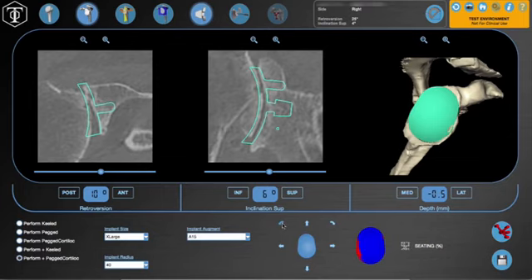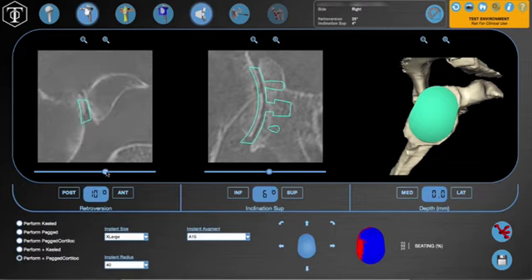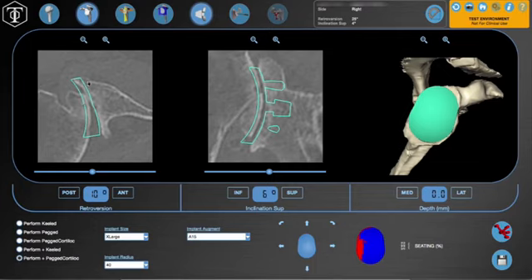So as we rotate the implant posteriorly, which you have the opportunity of doing on this program, you'll get more coverage from that posterior augment, preferentially posteriorly and inferiorly. And as I do that, you'll notice that the seating increases fairly substantially to 94%. I'm still a bit medialized, so if I want to play with the lateralization, I'm now at a 15-degree augmentation. I still have 81% seating. But if I look carefully, I do think that I'm still a bit in violation of this subchondral plate anteriorly, not just the osteophyte anteriorly, which we see here.